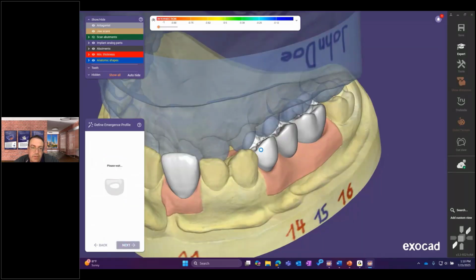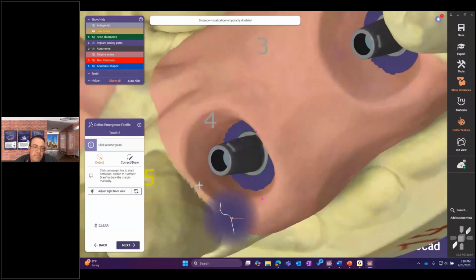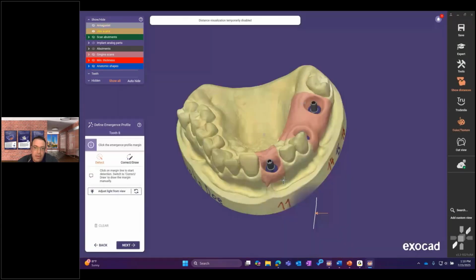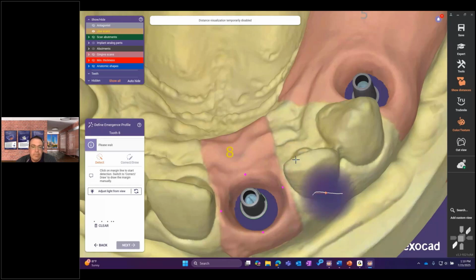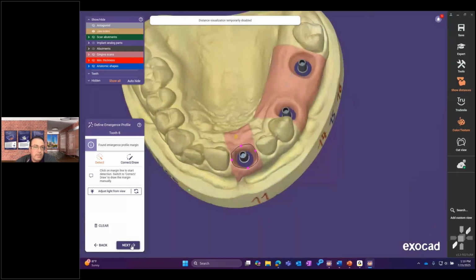I'll repeat that for tooth number 5 position here. And lastly, number 8. All right.